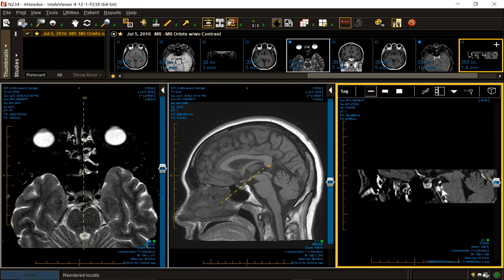I don't think it's the tip, though. Do you agree with that? Okay. Yeah. I think it's this thing right here. Okay. Thyroid ophthalmopathy.